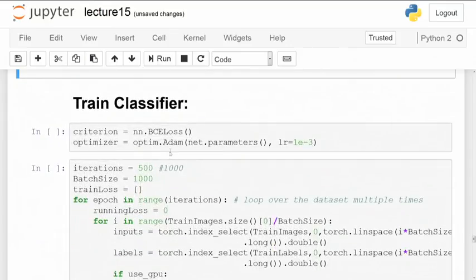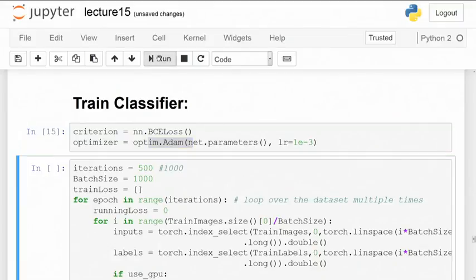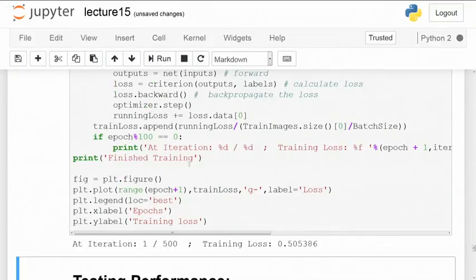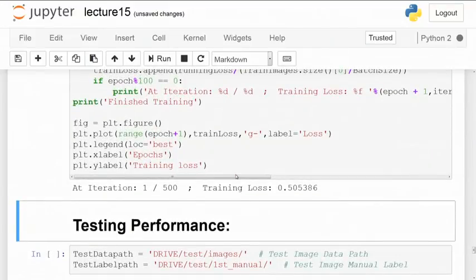Okay. Now, my next point is actually to train it out as a classifier. So, here I have changed out my criterion function or loss function to a BCE loss as with any kind of a classifier, and then I still go on to use my Adam optimizer itself. Okay. Now, here I start my training for the network. Now, this would also be taking some amount of time in order to train down. However, this loss is no more an MSE loss, but this becomes a BCE loss, and it is really hard to again start directly commenting.